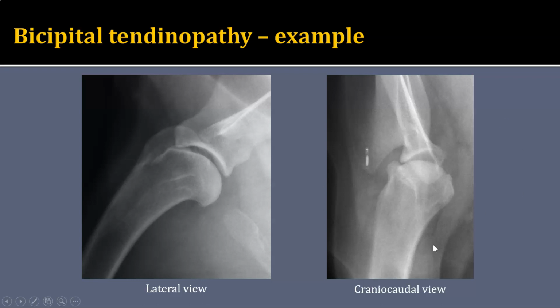One thing I want to point out on the craniocaudal view is that the shoulder joint in this patient looks quite wide at the medial aspect. In this patient, this is probably a true finding, but in some patients you'll see some incongruency on this view because the shoulder joint, remember, doesn't have true collateral ligaments. So the muscles and their tendons are acting as the collateral ligaments, and so there's a little bit more play or laxity in that joint. If we aren't holding them in straight positioning, you'll sometimes see some incongruency.